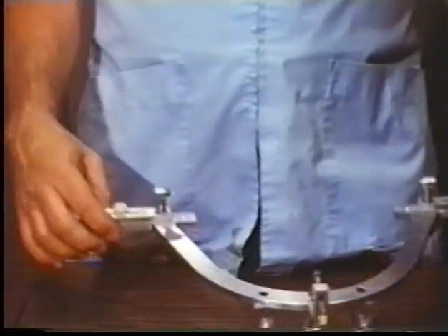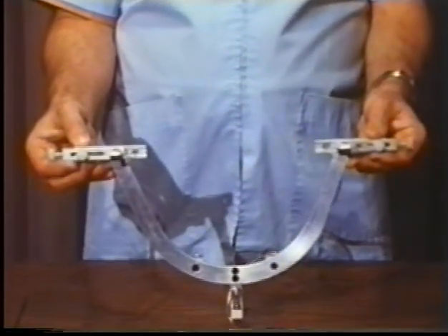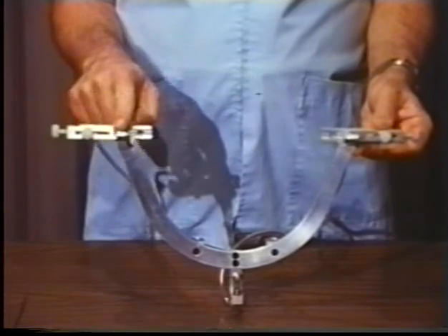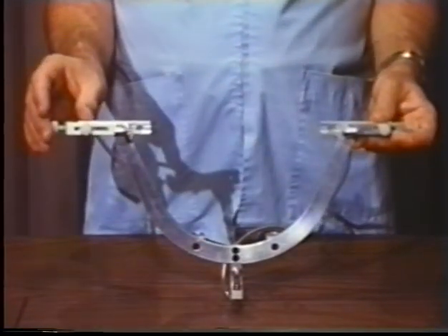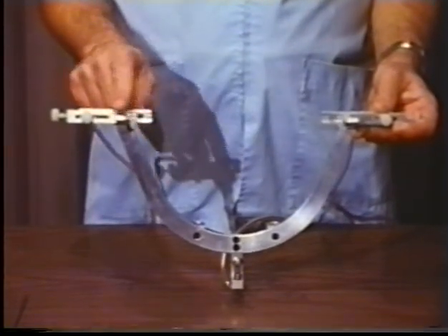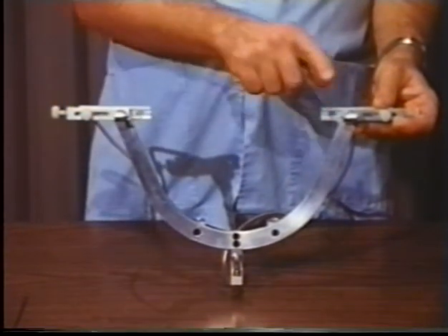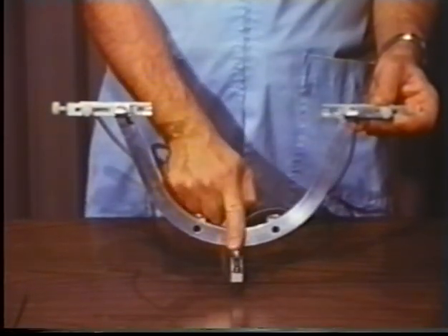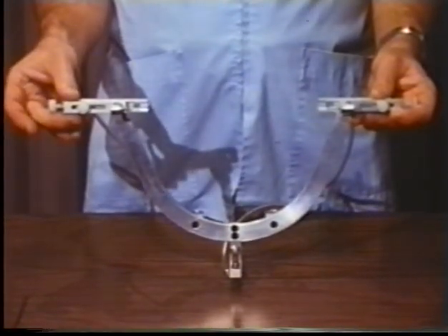The lower face bow is also a rigid, lightweight metal structure. It supports 3 recording drills, which are driven by high-speed air turbines. 2 of the drills are horizontally aligned on a common axis with their tips located precisely at a standardized distance of 220 millimeters apart. These 2 drills, in combination with the anterior drill, form a recording tripod.